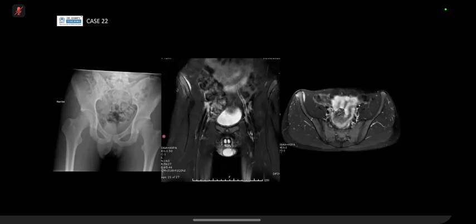So an avulsion fracture, you can see, is in an older child. The growth plates are almost fused. And main thing to note is that in kids, you need to know all your sites of potential avulsion fracture. And what you look for is the asymmetry between one side and the other side, making sure it's a properly centered radiograph. And this one it was, but I think the orthopedic surgeons just wanted further clarification on how it looks, and hence we've got a nice image for teaching.